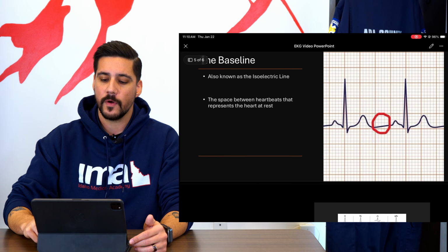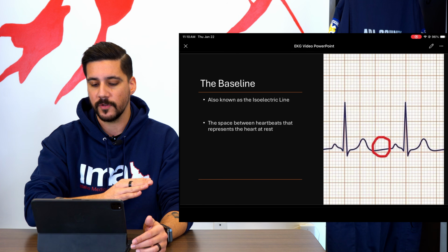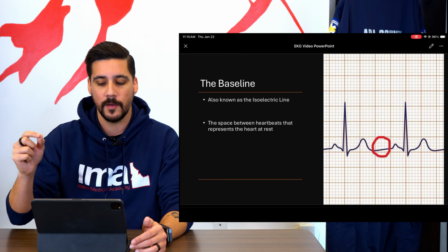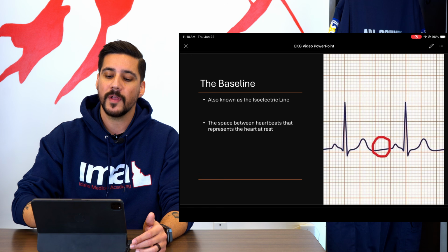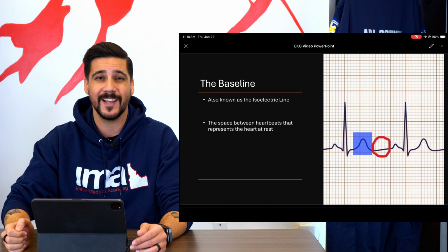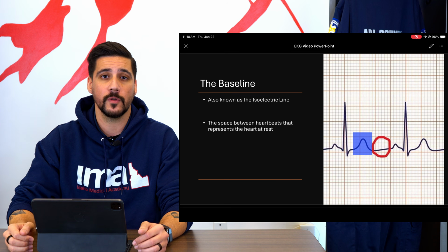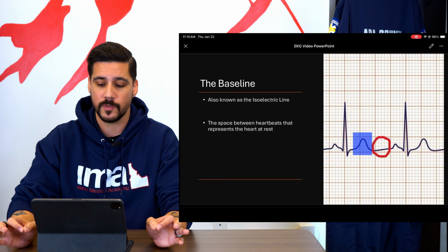Now the last wave I want to talk about, so kind of rehashing here, furthest to the left is going to be our P wave. The big spike is that QRS complex that's also going to have the atrial repolarization or opening up in. The last bump there, so little bump, big bump, and then the last small bump is what's known as the T wave. The T wave represents ventricular depolarization, okay, or excuse me, repolarization, misspoke there.